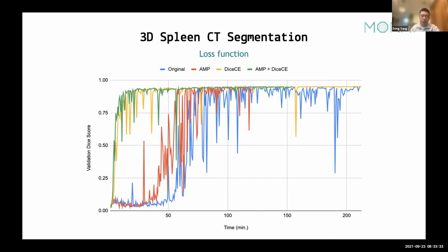But if we simply make that one-line change, you can see the improvement is quite significant. The model gets activated right away, and it maintains the high level all the time. This is only a one-line change. We keep the same configuration for the rest. You can see this loss function could play a huge role in your model training.